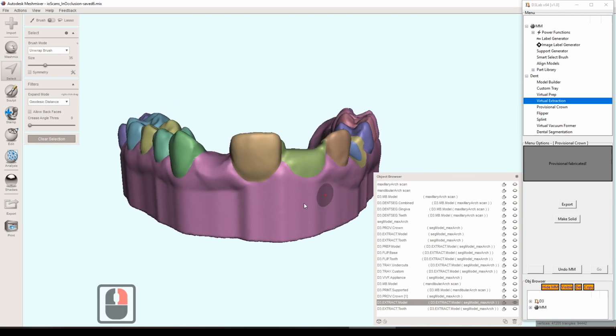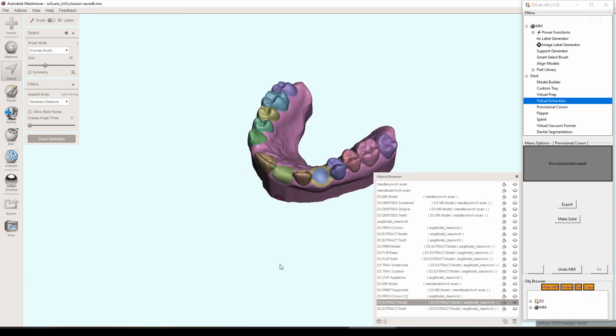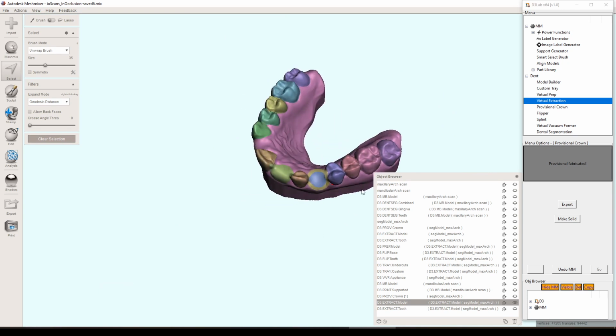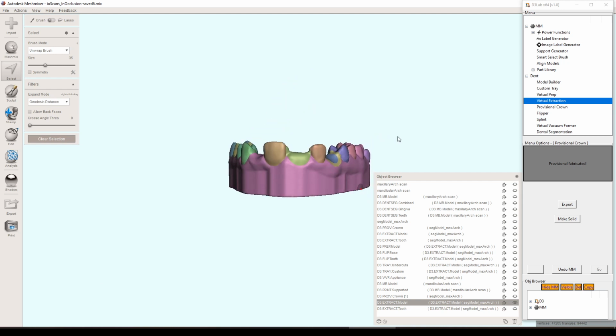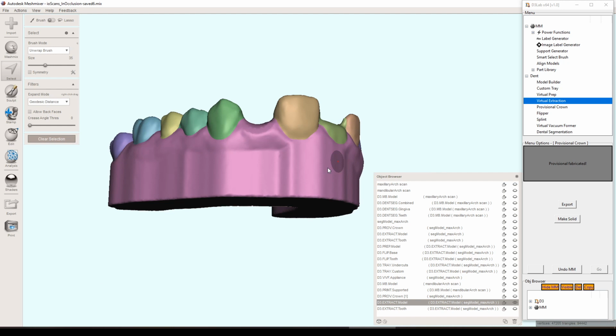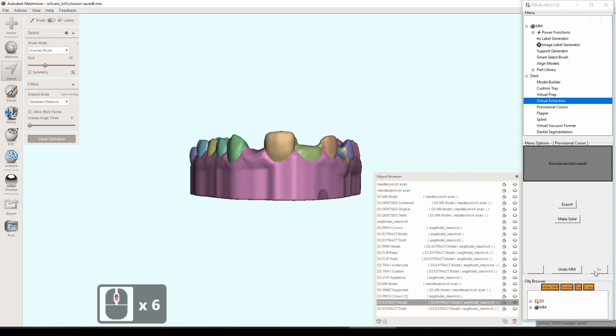But there's so many other cases where it just doesn't work. You can't do it that way, and it takes a lot of tinkering to get it perfect. So this way is the way that will work on basically every type of model, as far as I've tested, while keeping that anatomy over there. So anyway, that's that virtual extraction.